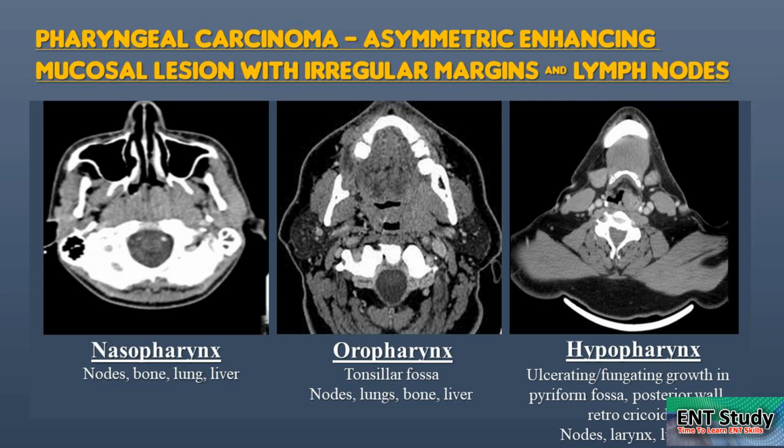Again, look at these vascular structures. Look at these side planes. These are the paralaryngeal spaces anteriorly and parapharyngeal spaces posteriorly. So these should be very black, clean areas. There shouldn't be anything grey interposing. Look at this part, it's very black.